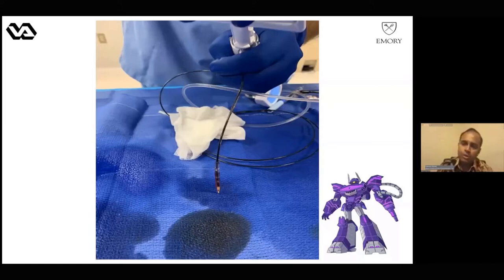And also the other thing is we are treating, at least for United States purposes here, calcium behind the stent. So that is actually an off-label application as well, because the approval for shockwave is more for de novo, as those of us who use it are aware. So there's some flavors there.